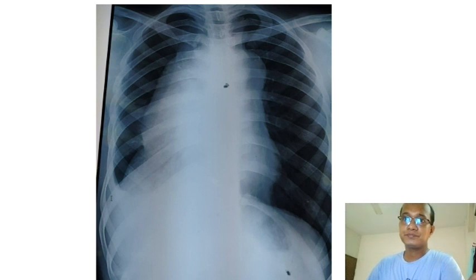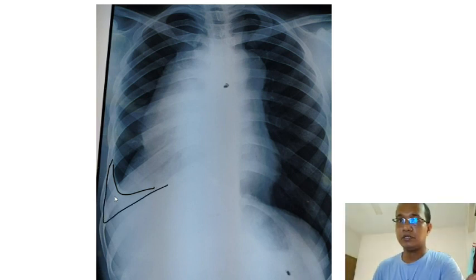The right costophrenic angle is obliterated. Actually the right costophrenic angle should be like this, but this angle is obliterated or obscured, whatever you say.